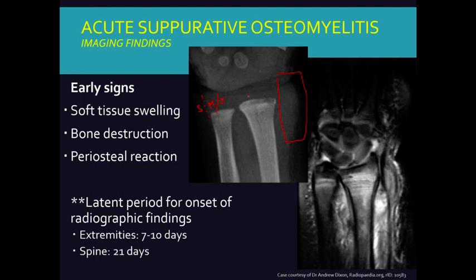So kind of this region, we're starting to have some osteolytic change there, but that's not as easy to call because this is still a younger individual. This is a very young person. It does look abnormal, and it is something you should follow up on, as they did in this case, where they went to an MRI, and now we can see how much more prevalent that change is.